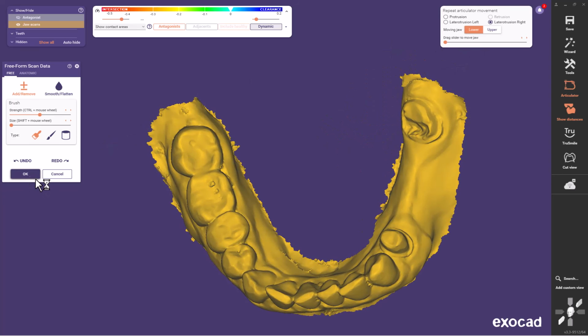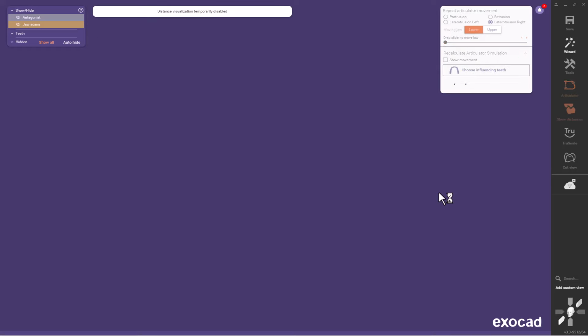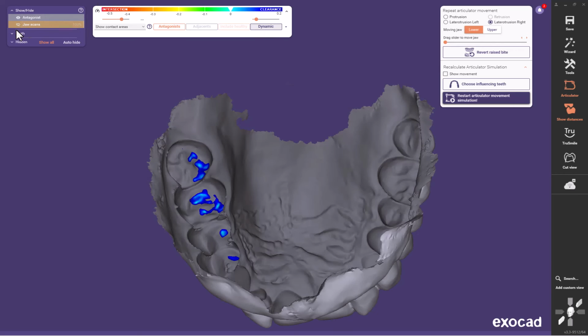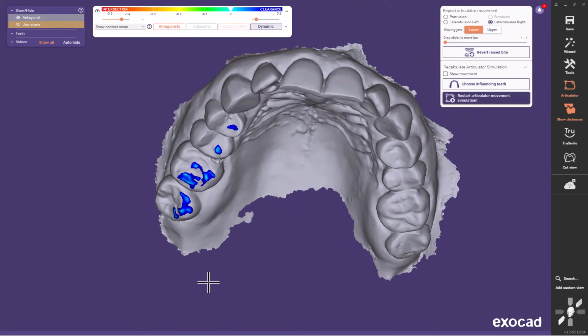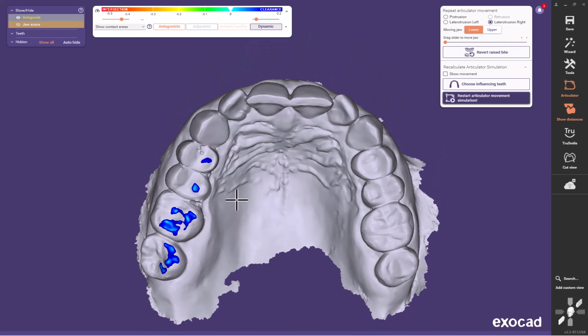Okay, we're starting to get marks on all of these teeth.